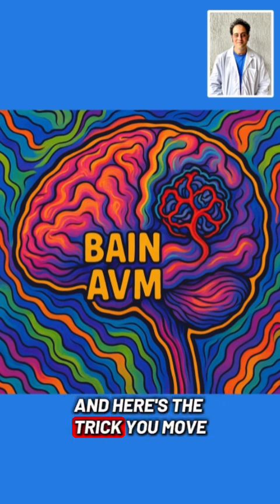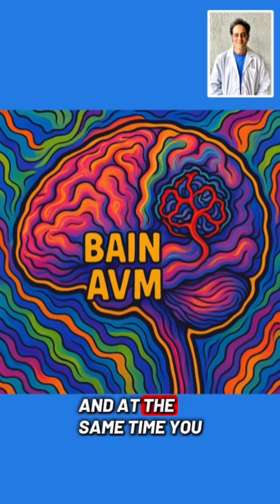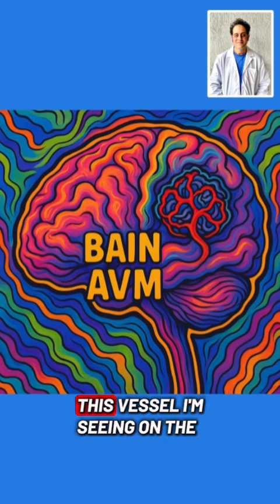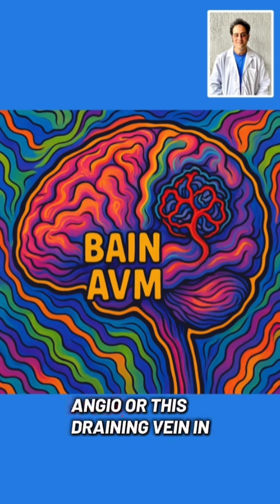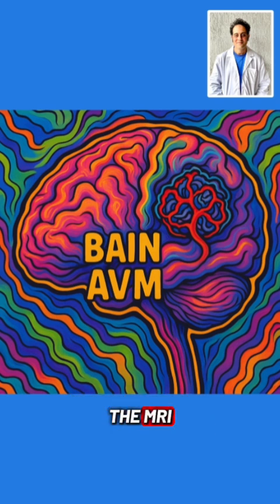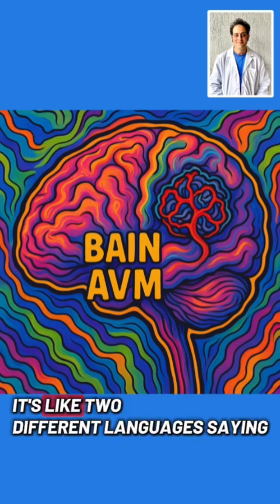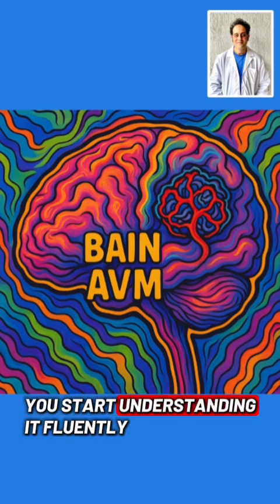And here's the trick. You move through the slides together, like you scroll through the MRI, and at the same time you scroll through the angiogram, walking side by side, frame by frame. You'll start to notice, oh, this vessel I'm seeing on the MRI, it matches this shadow on the angio, or this draining vein in the MRI, it's that same one I'm seeing emptying on the angio. It's like two different languages saying the same thing. And once you walk through them together, you start understanding it fluently.